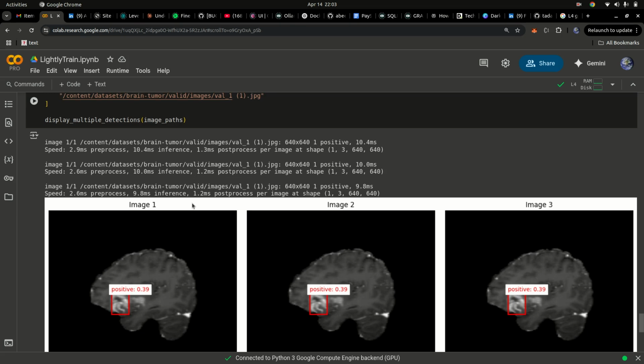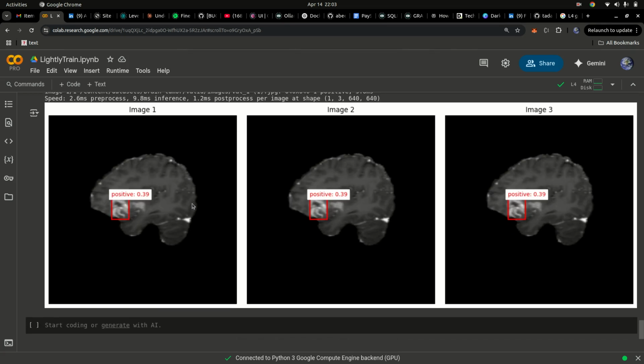But basically, once you specify all the images and run them through your model, it's going to first detect if there's a brain tumor, and then draw a bounding box around it. So which part of this image might the tumor be? You can see it's going to be drawing it around here. It's going to give a percentage of how sure it is that this area might be a brain tumor, and you can see those classifications right here, right?